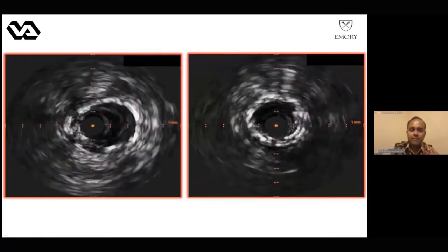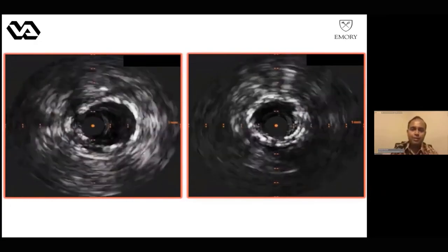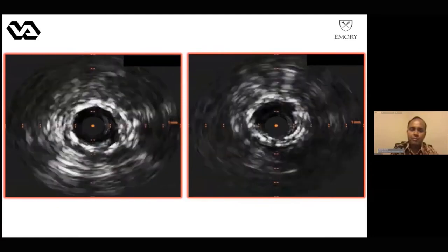And I will have Prof. Akiko help us with this. This is a relatively short run from the outside hospital that we got.